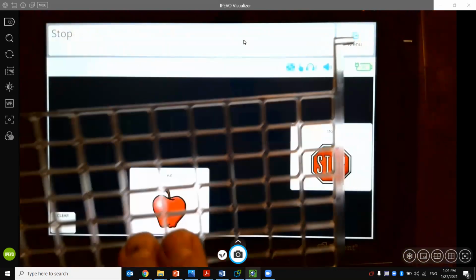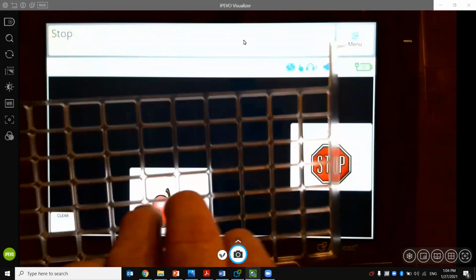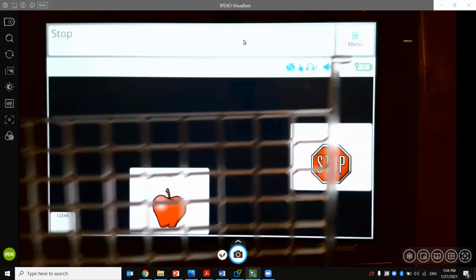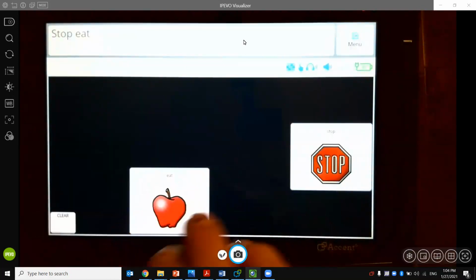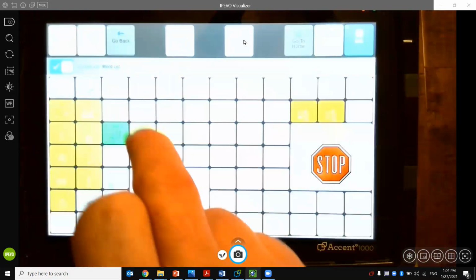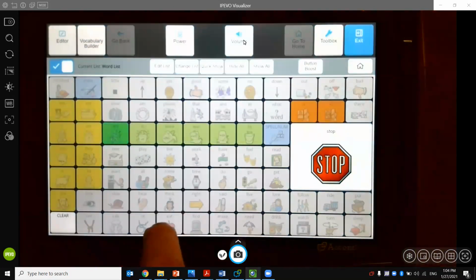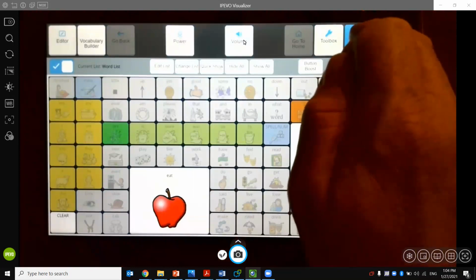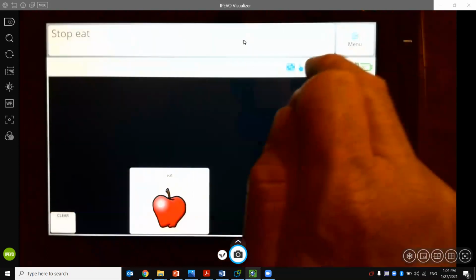And then when any finger gets in the hole and they have success, because they'll have a large area now that can work, when they have any one of these that work, then you're going to go right in here really quickly, go back to your vocabulary builder, touch that location, and then you're going to boost it back down. I've done this a few times, and I believe I should be able to do that within this setting here.